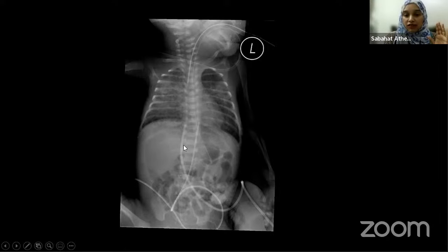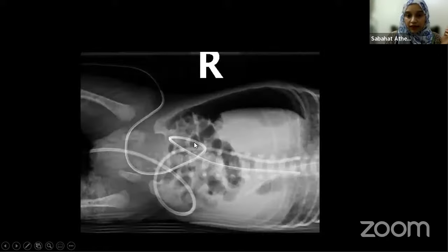I'm still looking for someone to tell me another finding, which is here. Or maybe it has gone. Pneumoperitoneum. Excellent. Why? You see this hole lucency here? This is a lucency which you can see. And when you do the decubitus, it becomes very evident. So this is a case of pneumoperitoneum with UVC, UAC, endotracheal tube, NG tube, and everything would need to be mentioned.